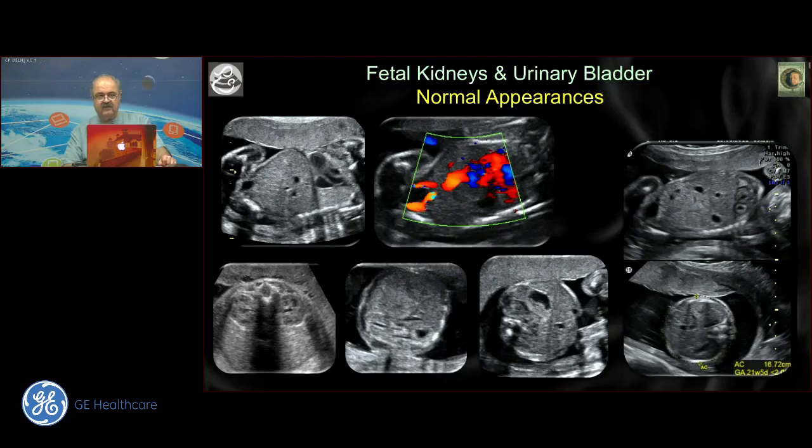Remember that when you look at the thorax and abdomen, you will always like to be sure that it shows a urinary bladder, and therefore you will watch the filling and the emptying of a urinary bladder. You will differentiate from cystic spaces that you see around, including the stomach, the gallbladder, the portal sinus, and so on. And then go on to make sure that yes, indeed, the kidneys are kidneys.